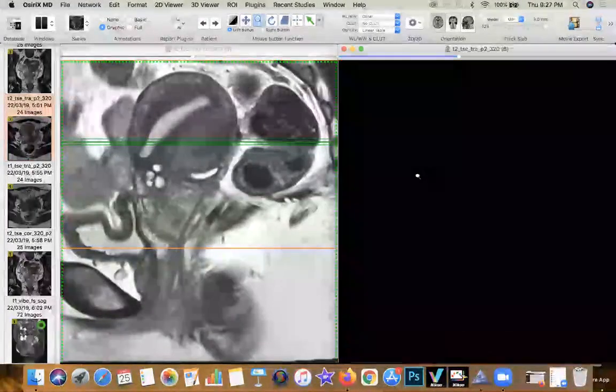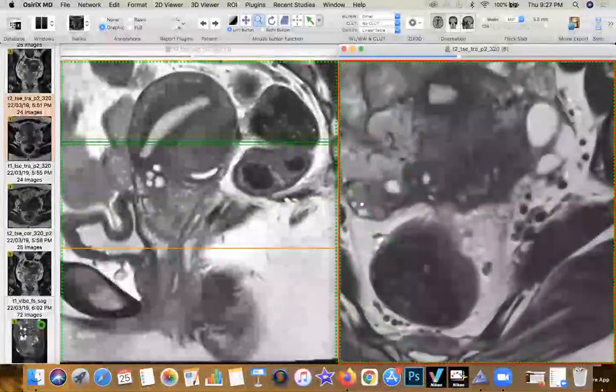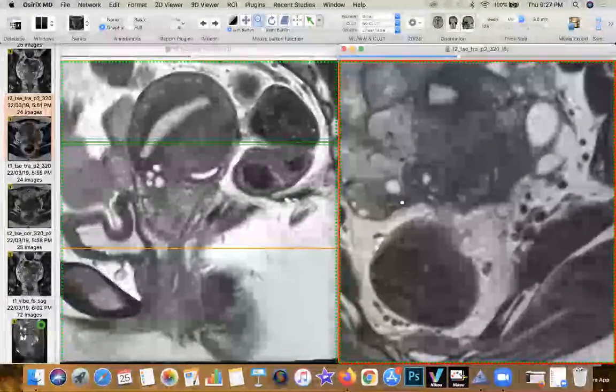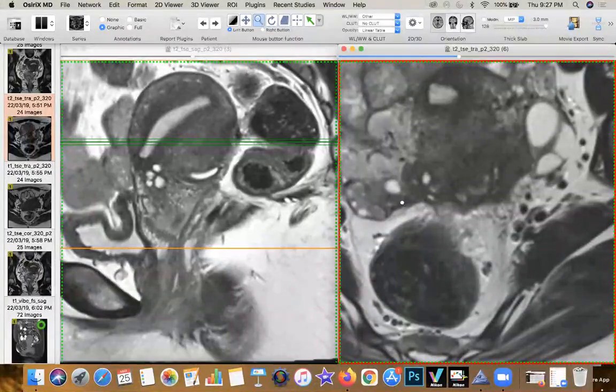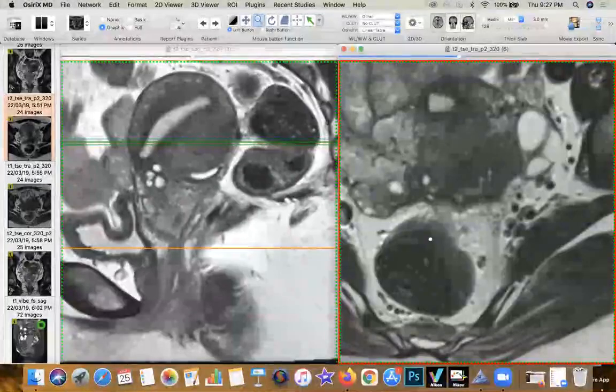And you can appreciate how there is this thick endometriotic tissue with fibrotic scarring, and you can see how it has kind of coated the medial surface of this ovary out here, and the ovary is kind of pulled or tugged inward. Now this, along with the rectal tethering, is a classic finding of what you get in deep pelvic endometriosis, and we call that the frozen pelvis.